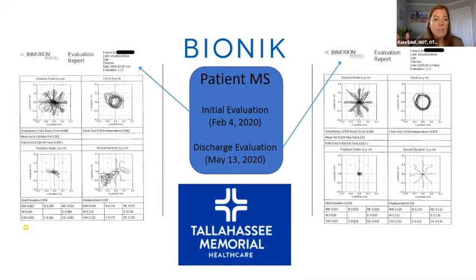I had never seen this device, never seen this reporting system, I didn't know what any of these words or metrics meant, I can look at the image on the left and then the image on the right and see, okay, that circle is much more defined. And that, I mean, the round dynamic, and I'll let Sheree jump in here in a second, but very clearly there's improvement here. Sheree, do you want to tell us what sticks out the most to you in these images and metrics?